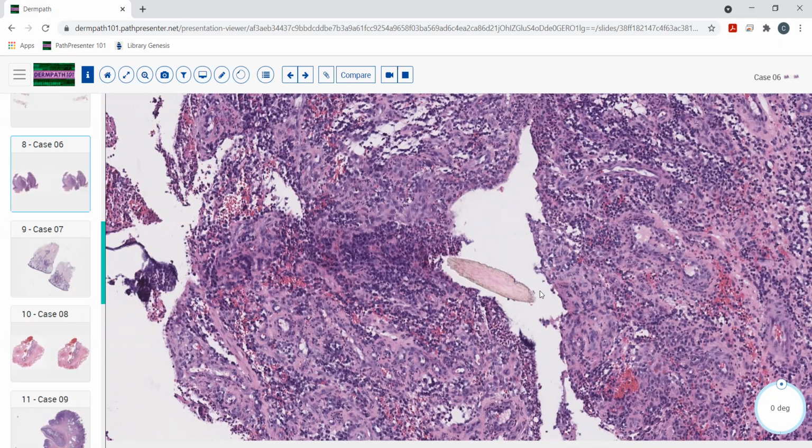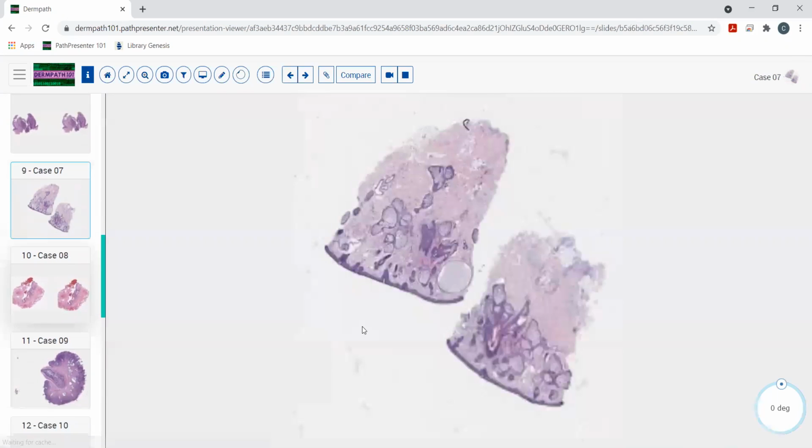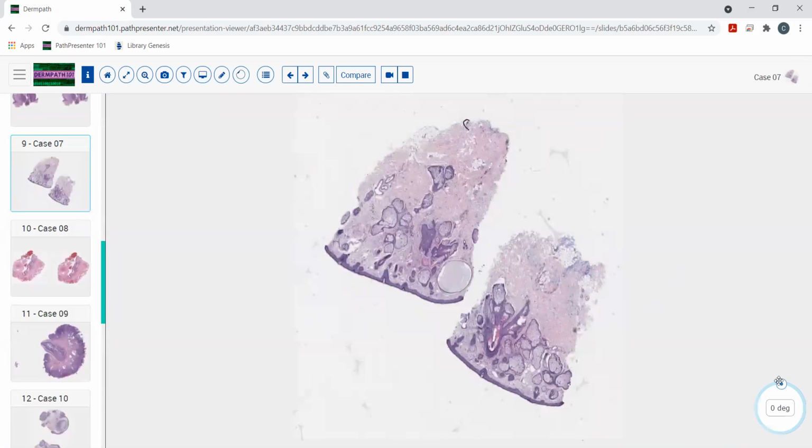Well, this is basically the same thing that's going on if you're a barber and you're cutting hair every day. Sometimes these hair shafts get embedded in your skin, and you get a papule there, and you biopsy it, and it looks like this. So just remember that while it's called a pilonidal cyst, it's really a misnomer. It's not really a pilonidal cyst. Okay. Now this is a cyst, but it's not a follicular cyst.